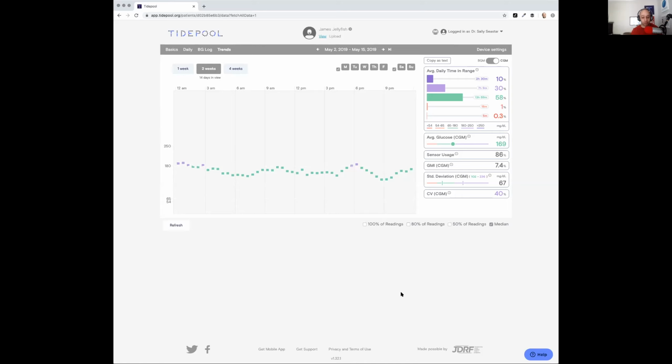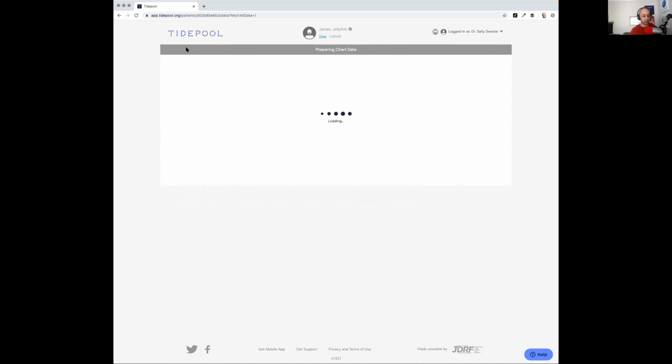Question in from Rhonda. Hi, Rhonda. Thank you. So if it says basal 150, does it mean it is 50% higher than what you entered? Does this one copy as well? Two different questions there around the temporary basals. Let me bring that back real quick.